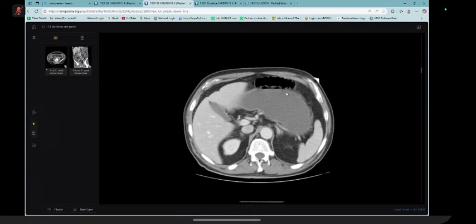Perfect. You nailed it perfectly. The purpose of putting this case is obviously just to identify this. This can be asked as an abdominal X-ray in the beginning, and they want you to suspect the inguinal hernia. There may be some bowel shadow at the level of the pubic tubercle region, and they want you to say pertinent negatives, like ischemia, perforation, ascites, any other problems. You need to tell them hernia. You need to say the type of hernia, whether it is wide neck, narrow neck, something like that. So this case is related mainly to the pertinent negatives, and the management, which you said very nicely.